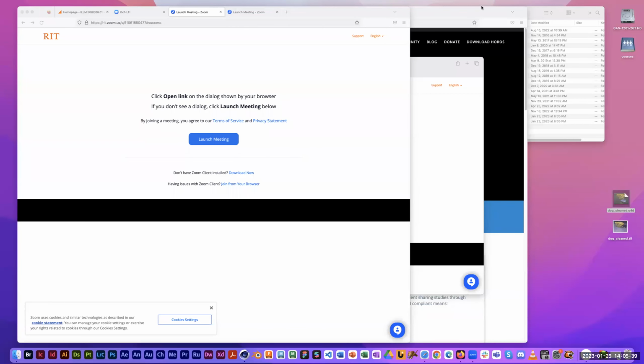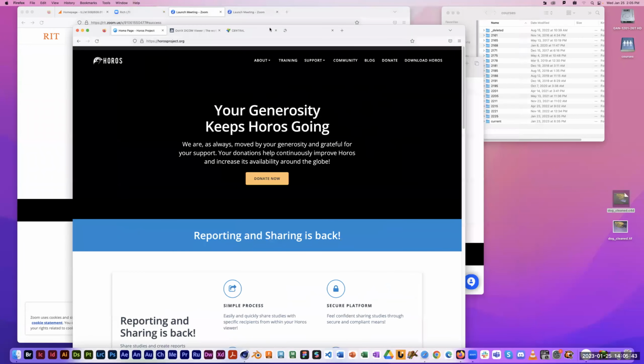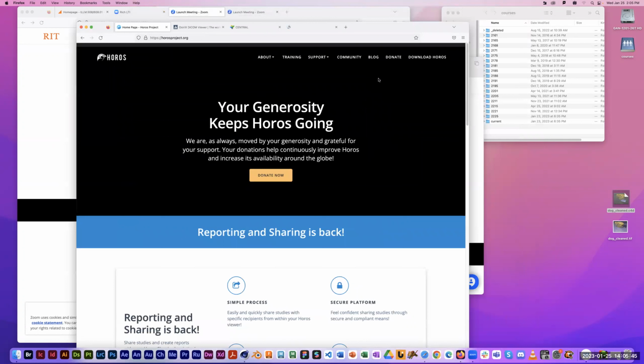All right, so today we are going to talk about Horos, and I'm going to demonstrate it for you. Before I actually get into demonstrating the program itself, I just want to talk about two other quick things. First of all, if anybody's interested in downloading Horos, I included the link in the syllabus, but I want to show you a little trick in case anybody's tried it.